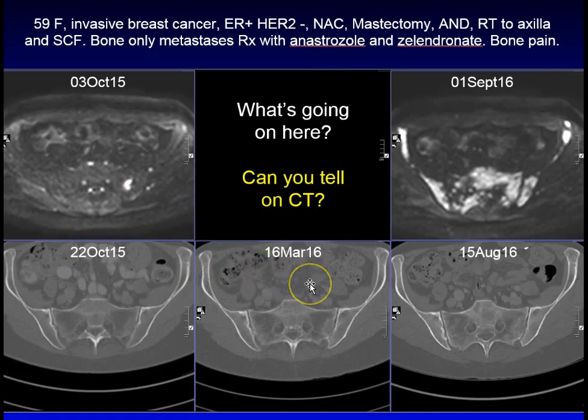On her next occasion, she is monitored with a CT scan. The CT scan looks unchanged. The disease is called stable. Then the patient undergoes another CT scan. At this stage, the CT scan is suggesting possibly some disease progression. It's quite difficult to see where, but I guess, over here, for example, next to the SI joint, there seems to be some sort of change, and here, just underneath the disc, within S1, we see some change.